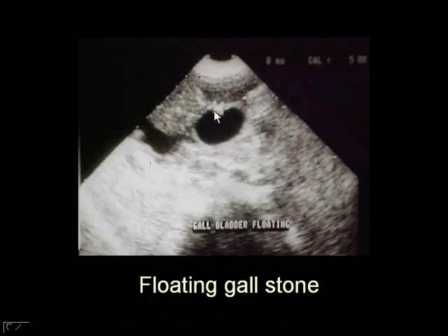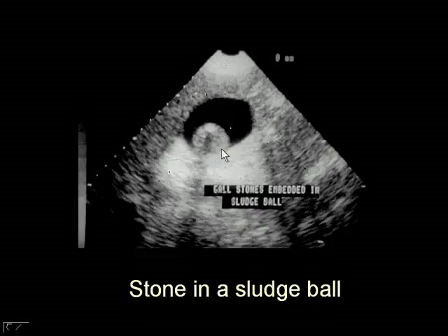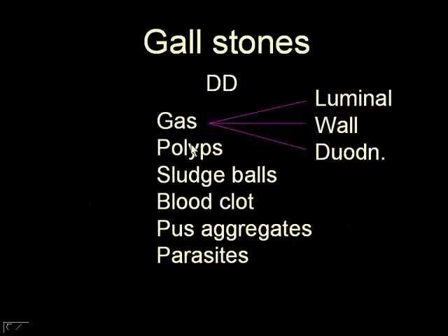That's a floating stone, a small stone which is pure cholesterol, which is lighter than bile, and it's floating up there. That's a gallbladder sludge, tumefactive sludge, but within the sludge there is a stone, and that's the shadow of the stone. So we can get all patterns happening there. Differential diagnosis: gas, polyps, sludge balls, blood clot, pus aggregates, parasites, and so on and so forth.